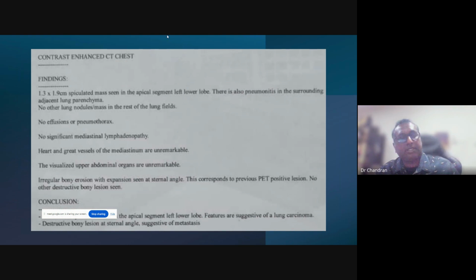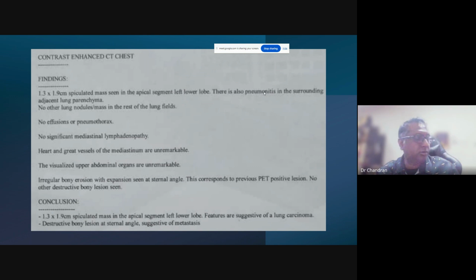Okay. Another example, this one is the chest CT scan. Sorry, moving here. I'm just about to finish. Don't worry, I'm not going to make it very complex. Simple. Then if you have any questions, we can ask them. This is the chest CT scan.